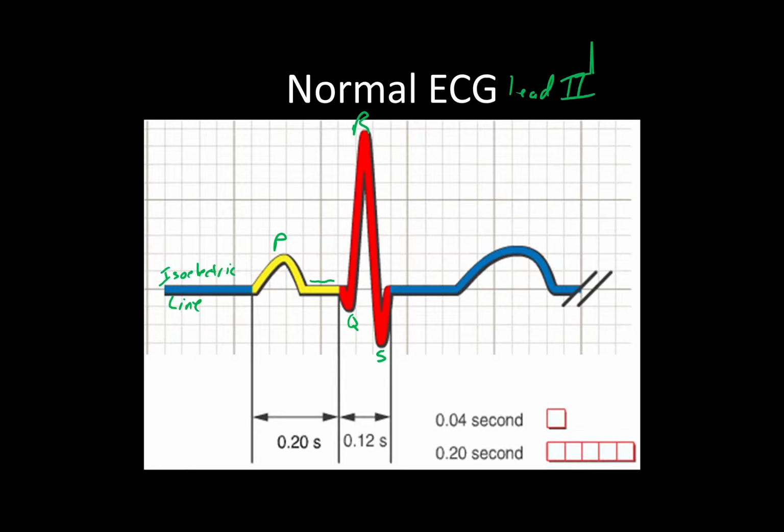We'll talk some more about the different combinations here in a bit, but the idea is that QRS follows the P wave and its flat spot. And after your S wave, you have another isoelectric line, which is then followed by the T wave. So this is your standard P, Q, R, S, T waves.